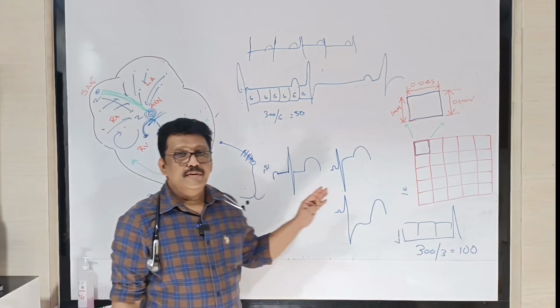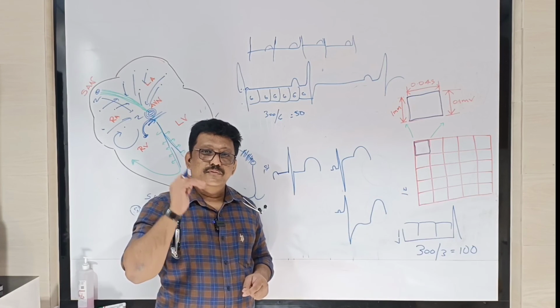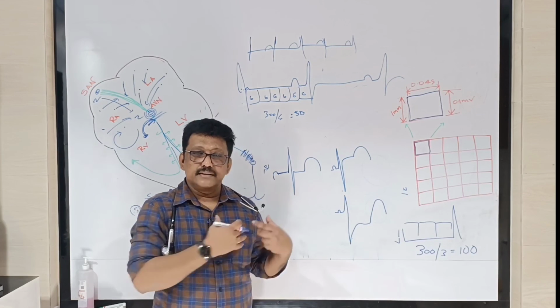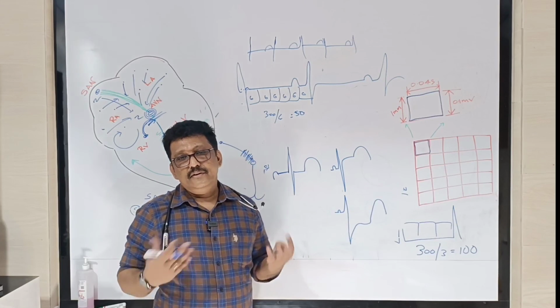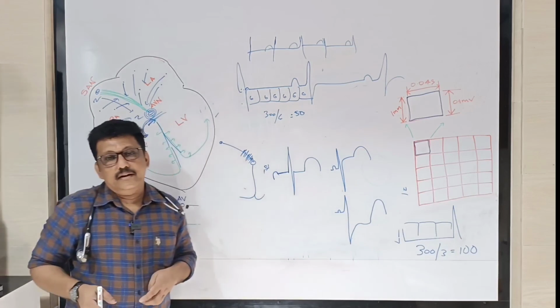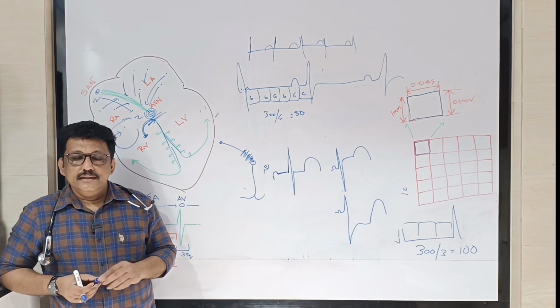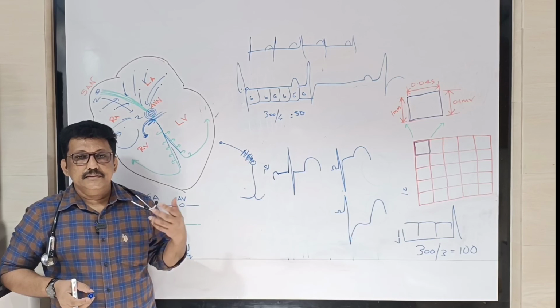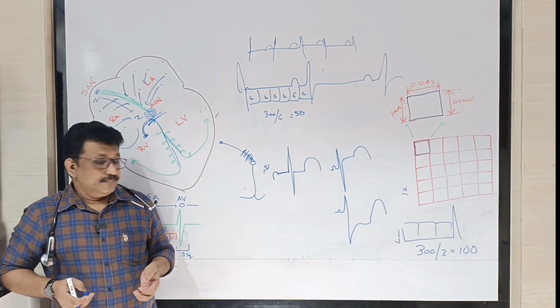A patient who is coming with acute chest pain, if the ST segment is elevated in V1, V2, V3, V4, the anterior chest leads, then you have to diagnose it as acute myocardial infarction, anterior wall MI. If you do a troponin I or CK-MB, it can be elevated. These patients should be taken for thrombolysis or primary angioplasty.